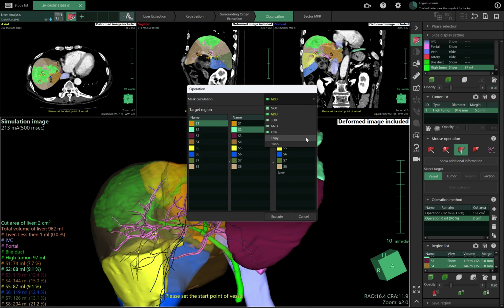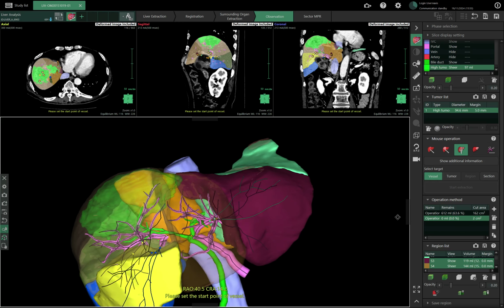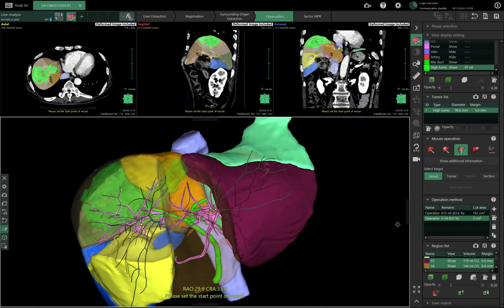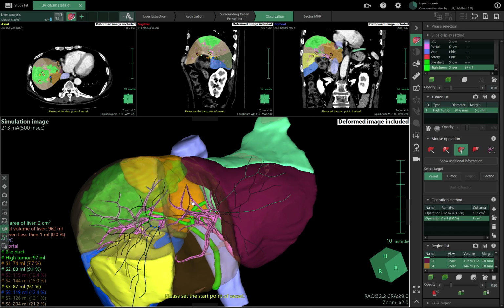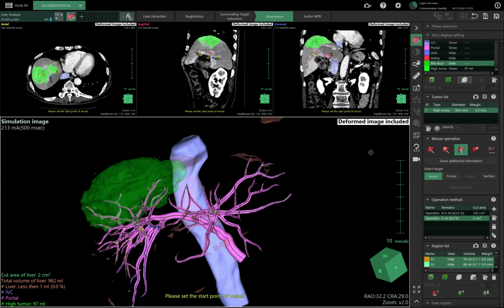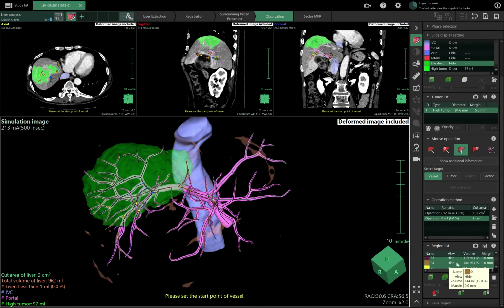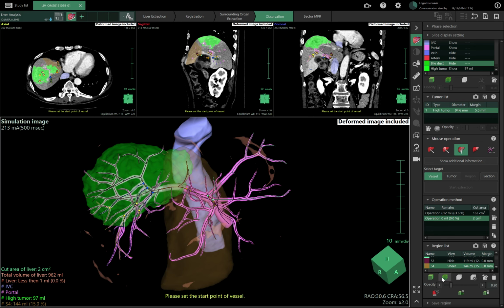In the second session I do for liver training, because in some cases like this one it will be nice to have some other parts. For example, in this case, segment 4A, that will be the upper part of segment 4, I will just hide everything else. I will hide everything here, not to be shown. Everything will be out. And here I will just show you segment 4 in a translucent way.